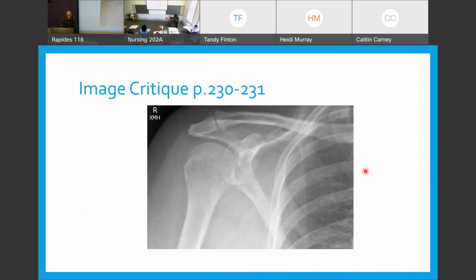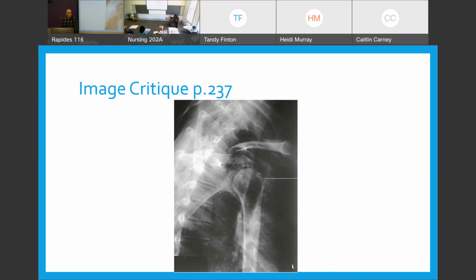Ms. Shelton, let's go. This is shoulder. Here's your what? Okay, look, I'm crosshairing right about there, about an inch below the what? So that tells me it's a shoulder, okay, and rotation? Internal. Internal rotation, and let's see, the relationship of the humeral epicondyles. Perpendicular. Perpendicular, very good. All right. Hard one, hard one, hard one.